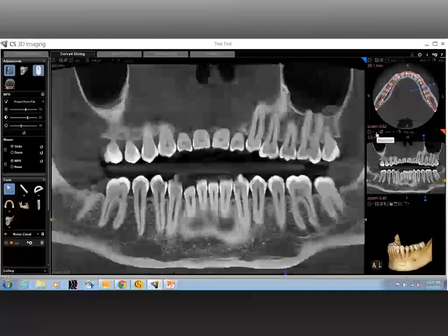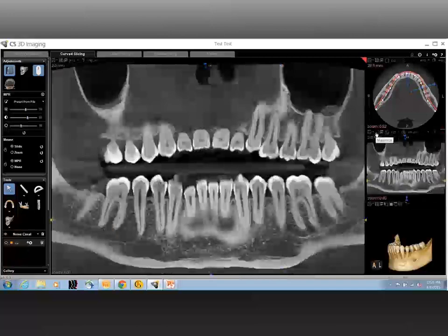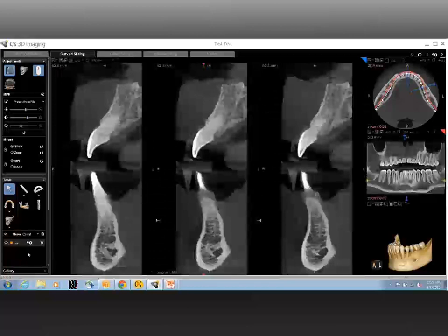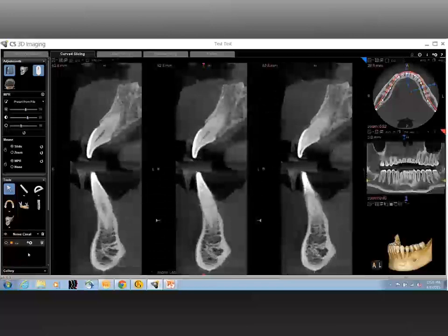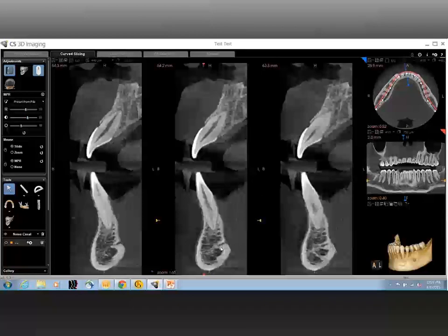You mentioned the lingual foramen. If you would, I believe we'd find the lingual foramen right in the midline in the mandible. If you could show us that also. That is very well noted. Let me just scroll around and get to the exact view. That would show the lingual foramen. If you notice, it's just like the name implies. It is on the lingual surface, and that's where it is.